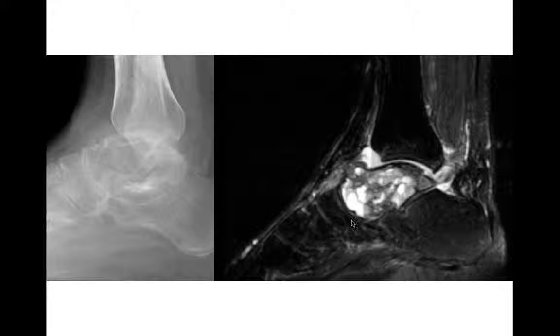This is just to show you that you can get giant cell tumors occurring in the ankle. Not the most common location for them. We tend to think of them in the long bones near the articular surface, but they can occur in the calcaneus and they can occur in the talus in this case. So this is a geographic lytic lesion, which we don't see very well on the radiograph. They go to MR and we nicely see the fluid levels in the lesion.